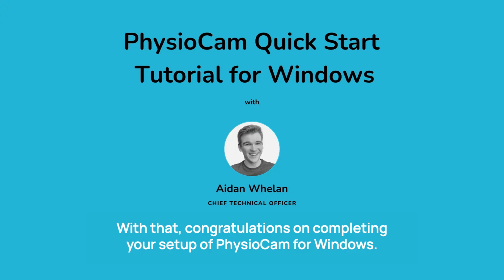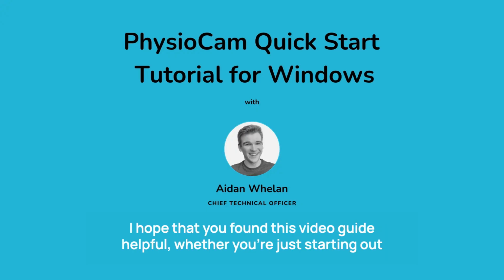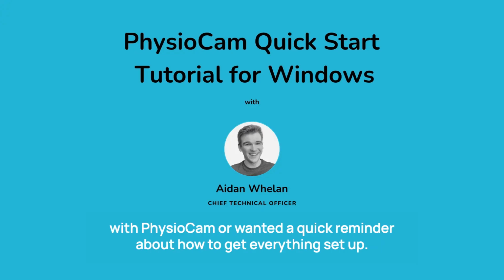With that, congratulations on completing your setup of PhysioCam for Windows. I hope that you found this video guide helpful, whether you're just starting out with PhysioCam or wanted a quick reminder about how to get everything set up.